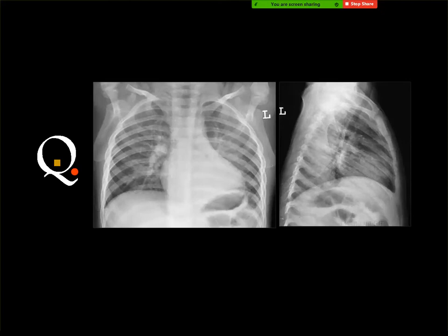There is prominent right lower lobar pulmonary artery. Prominent vascular anomaly, but I don't know the name. AVM, no. This is normal appearance because the heart is covering the rest of the pulmonary vessels. Normal. Miliary shadow. Looks like miliary shadow.